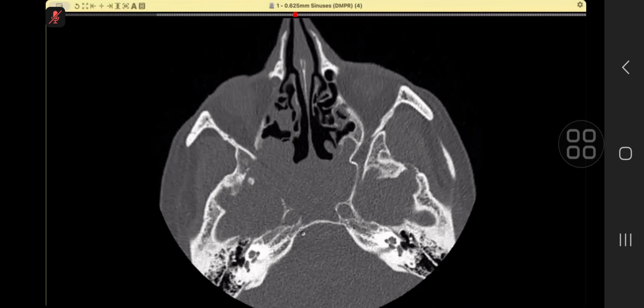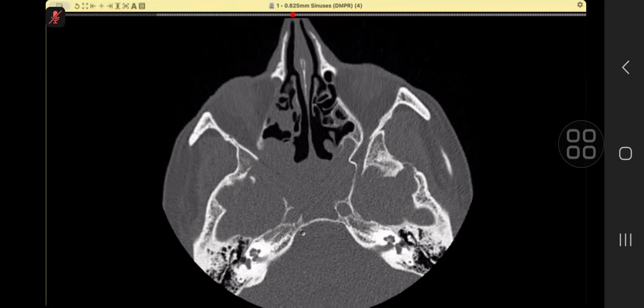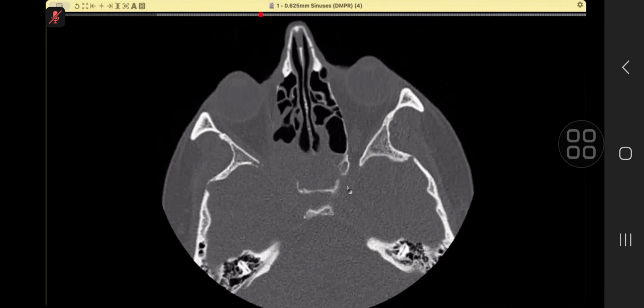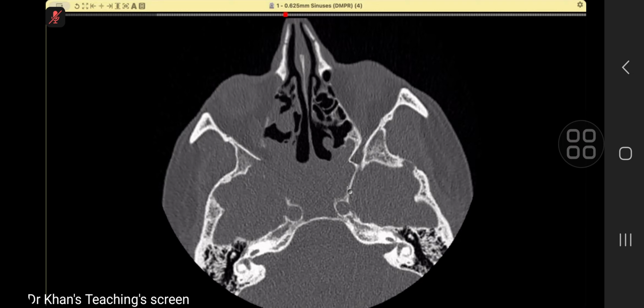Sir, anteriorly is this. Where is the sphenoid sinus? Sir, it is being involved by the mass. So what does that mean? The region of the sphenoid, sir. So it's a sphenoidal lesion, posterior and midline in the sphenoid region, involving the clivus and the posterior nasopharynx and extending laterally.